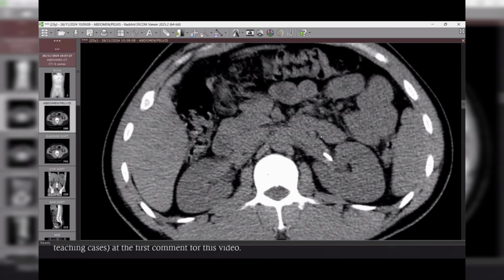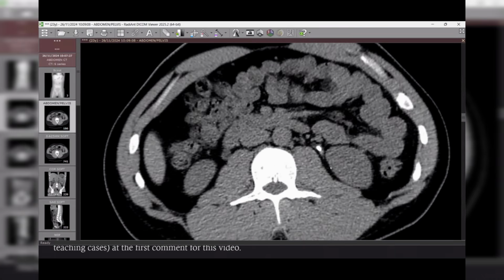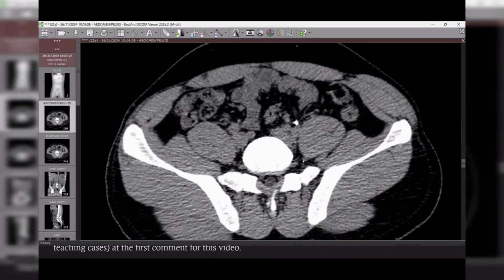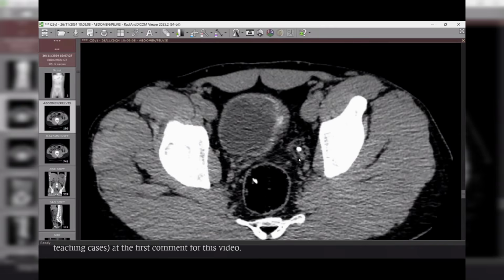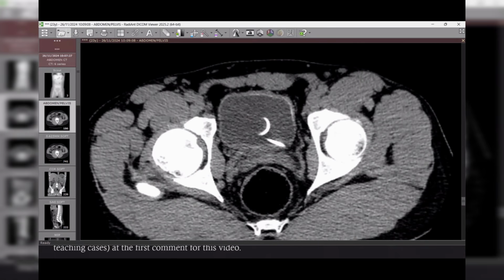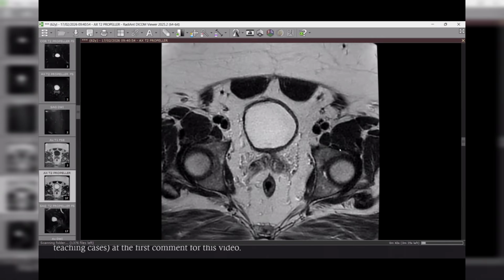The tuberculous calcifications most likely involve the upper ureters and kidneys. The bilharzial most likely involves the lower ureters and urinary bladder. We started with this simple case's findings. This patient was complaining of dysuria and hematuria.